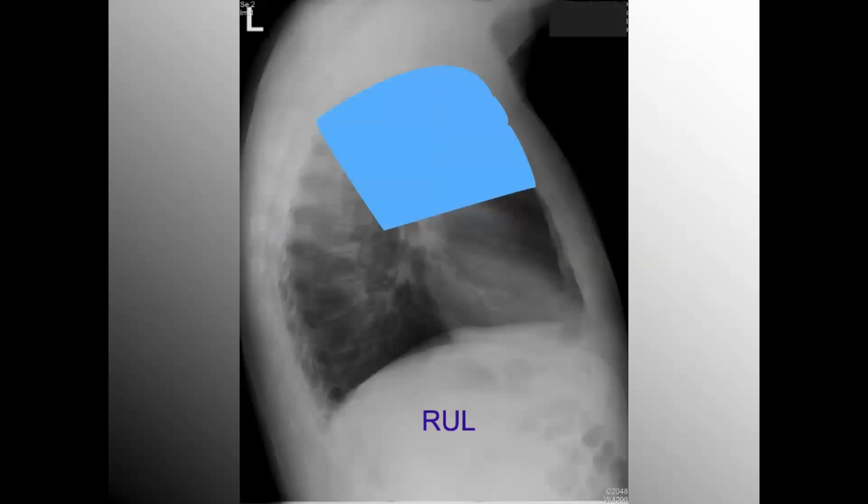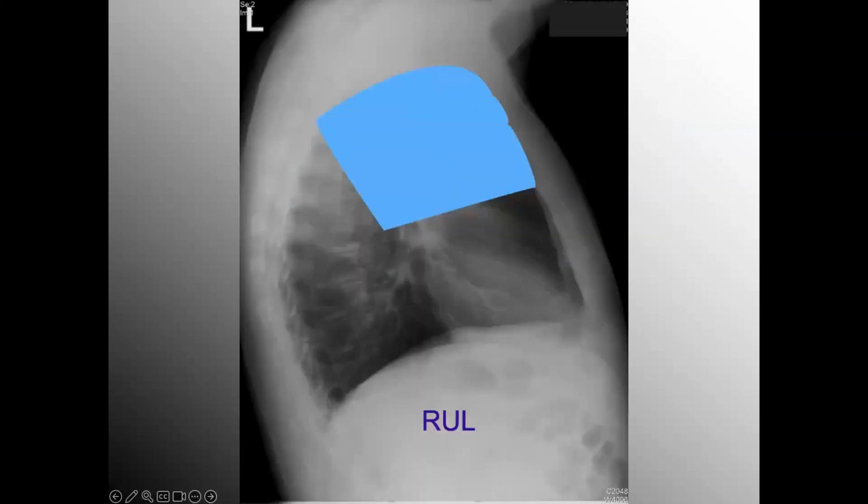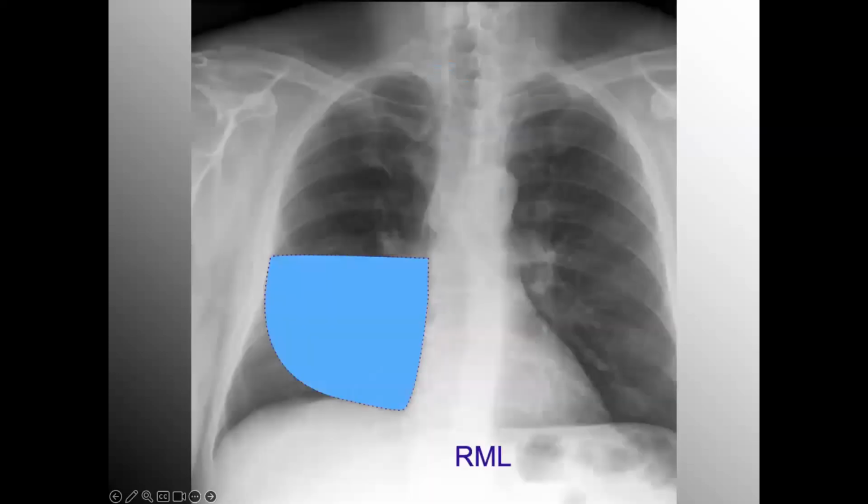Well, notice the right upper lobe in a lateral view. And be reminded that a majority of the posterior surface area of all the lung tissue is attributed to the right lower lobe, as you'll see here in a moment. So I want to back up just for a second here, looking at right upper lobe on an anterior view, and then a lateral, just how little of the lung tissue in the posterior plane that the right upper lobe occupies. Here's that right middle lobe.